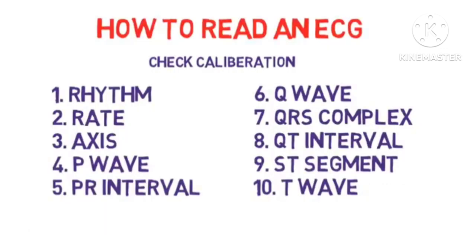So this is all about ECG. Always think of these 10 steps in this manner and you will be able to detect the majority of arrhythmias very easily.